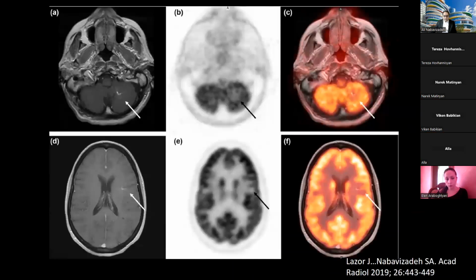And another patient, DVA in left cerebellum. Again, you can see a hypometabolic region corresponding to the DVA territory. And this patient, though, doesn't have significant hypometabolism in the DVA territory. So not every patient with DVA has metabolic changes on FDG PET, but some do.